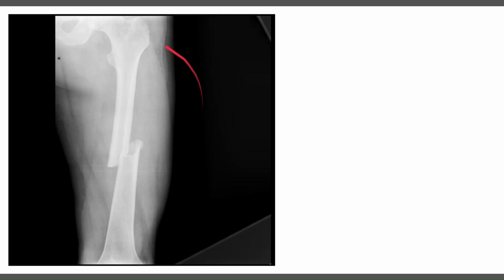So here's our first x-ray. We have an AP of a skeletally mature left femur, and it's showing a fracture of the middle third femoral diaphysis. In this talk, we're describing the displacement. Now, first of all, is it mild, moderate, significant? I would say it's moderately displaced. And which way is it displaced? Well, like we said, pretend you're going from proximal to distal. You're walking along this femur, and which way do you have to move to describe this fracture? Well, you have to move laterally. So we say laterally displaced middle third femoral shaft fracture.